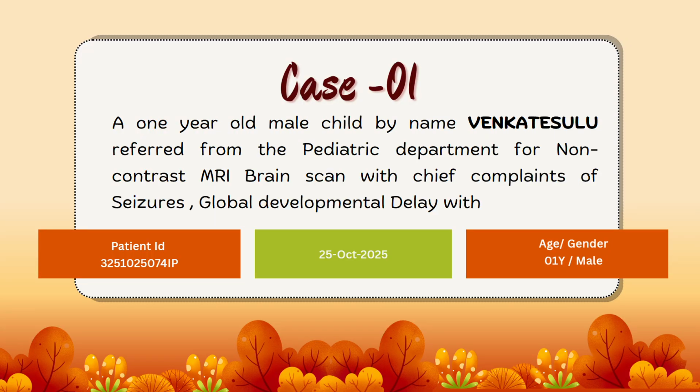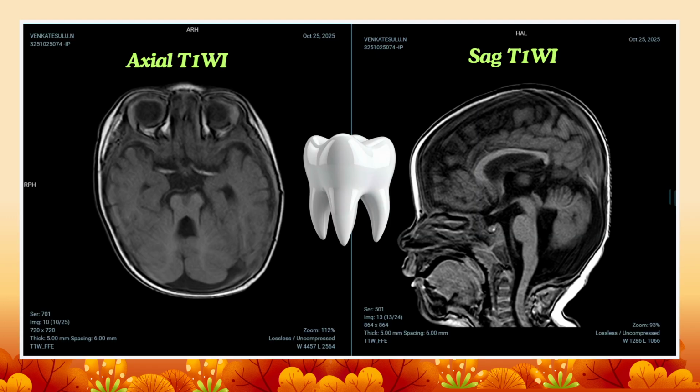Here, a 1-year-old male child by name Venkateshlu, who is referred from the pediatric department for the non-contrast MRI brain scan with chief complaints of seizures, global developmental delay with ataxia. The scan was done in the Department of Radiodiagnosis, Government Medical College, Anantapur with 1.5 Tesla MRI equipment.